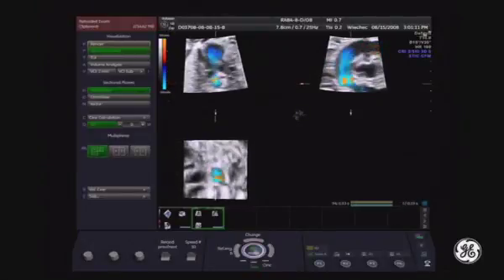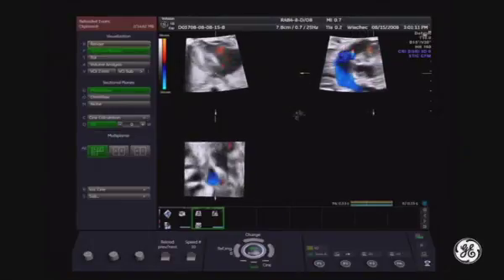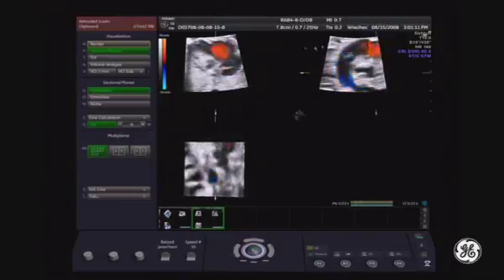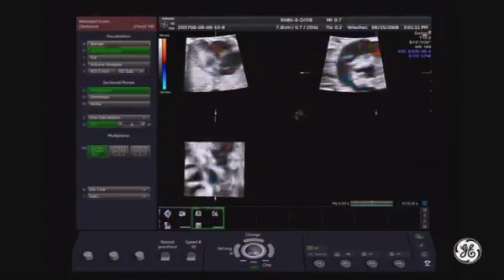So I will select reference image B, and then I will bring this at the level of four-chamber view. You start seeing that only one inflow is visible. The inflow on this side is not. Let's move to the higher levels with our pivot point.